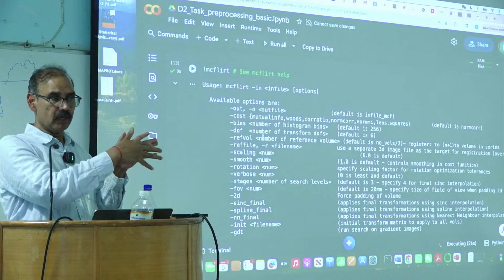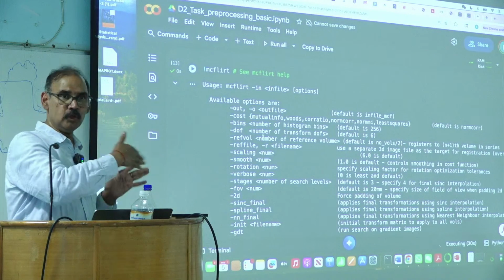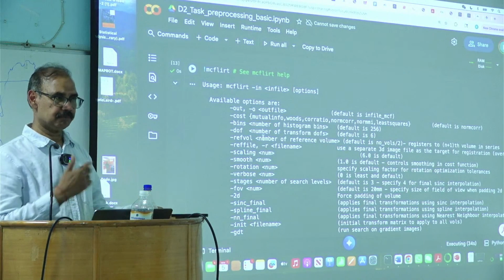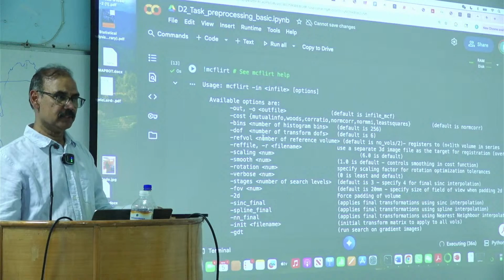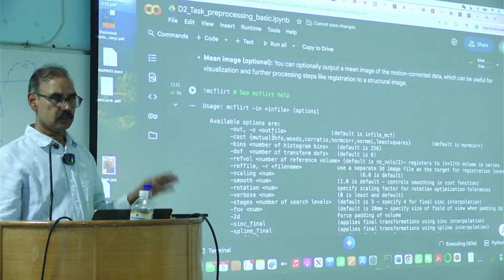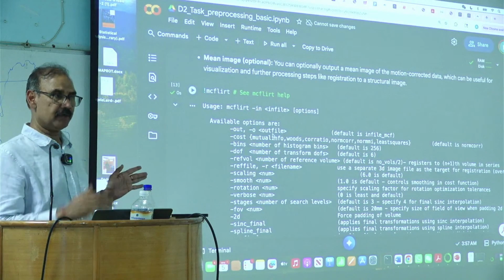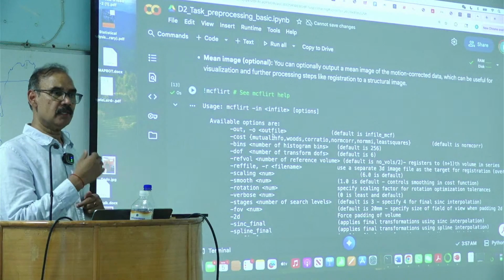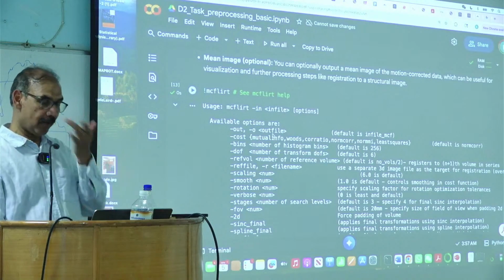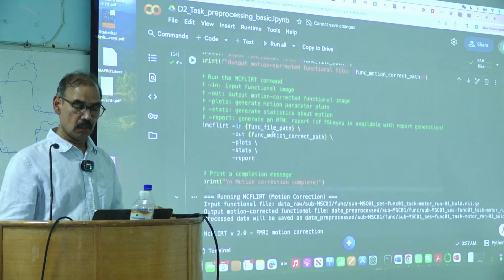Then you do it for number three with one, number four with one, and do it for, in this case, all the 818 images, right? And so that is for the functional data set, right? So in this case, it's a linear or an affine transformation. So that is why it is fairly quick, okay?